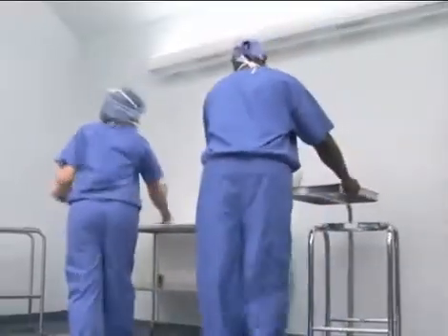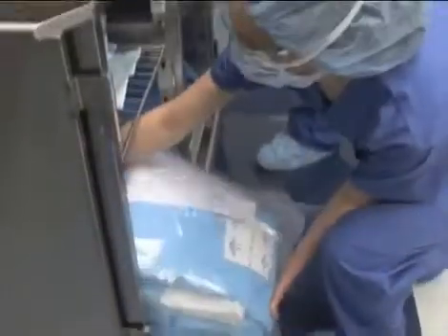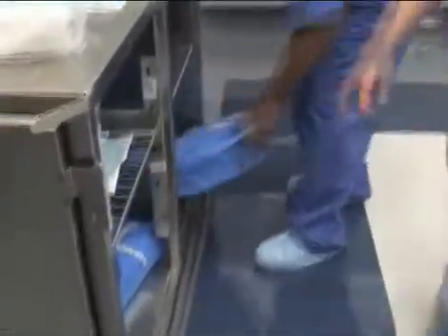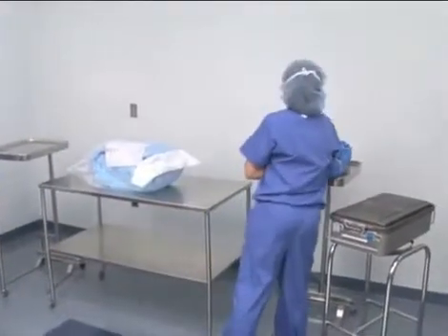Opening a case means to prepare the surgical suite for a procedure and open sterile items. All equipment and furniture is arranged, and sterile supplies are brought into the room. Depending on the complexity of the surgery, the amount of equipment to be prepared, and the degree of the emergency, the scrub and circulator open the case about 15 to 20 minutes before the start of the surgery. In extremely large cases, more time may be needed to allow for opening of supplies and setting up of the case.